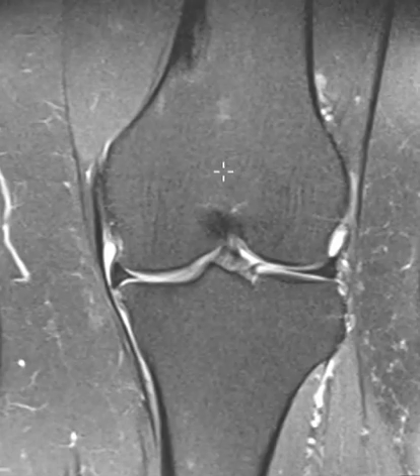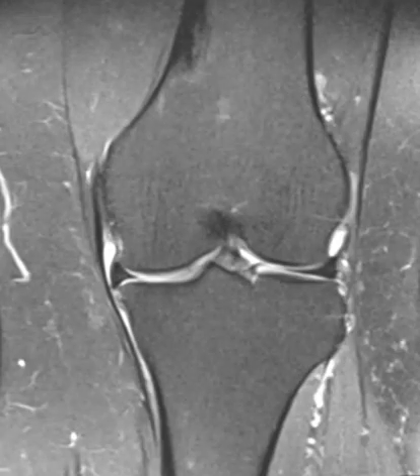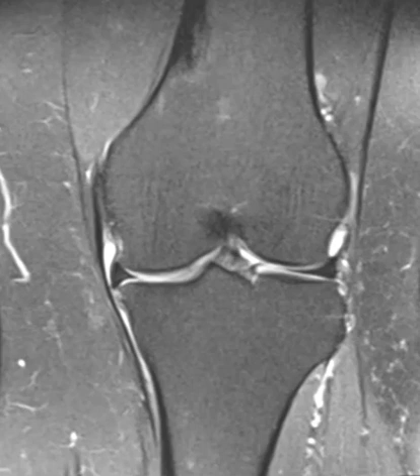bursitis. Just incidentally, you may note up here this is a benign bone lesion in the femur, and this is probably a non-ossifying fibroma, which is partially healed. It's just a benign bone tumor.